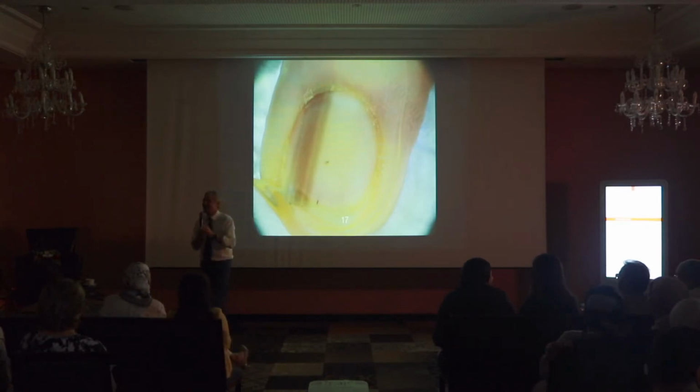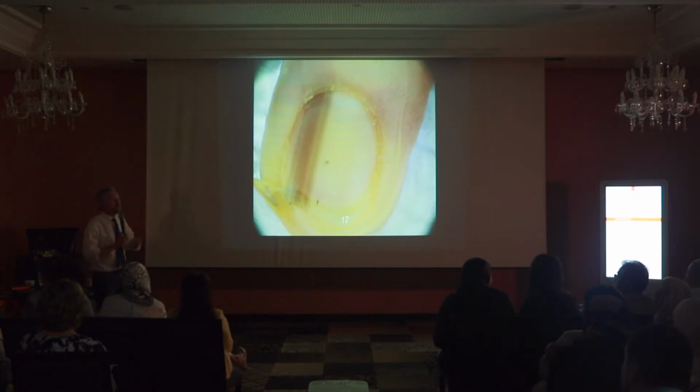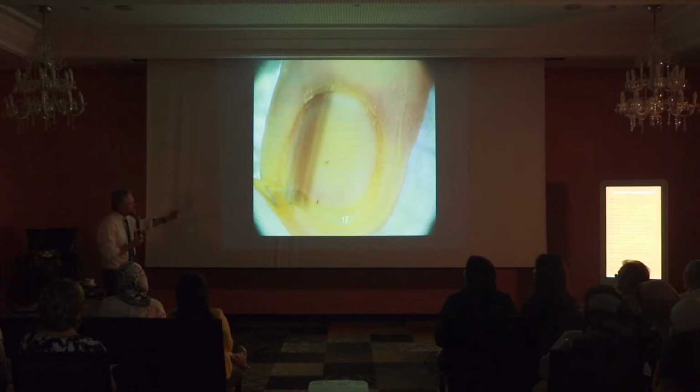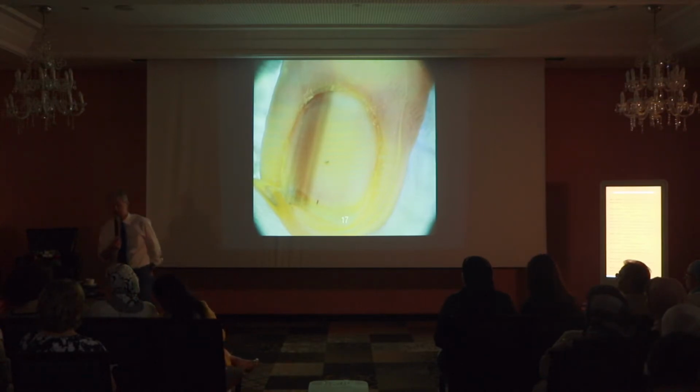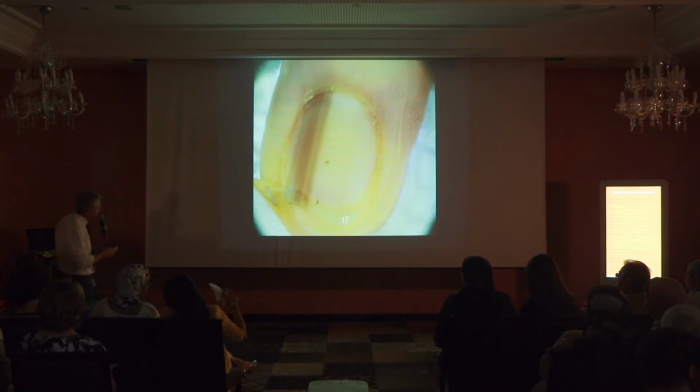So, it means that it's painful and so on. So it's better to make a follow-up here, right? It's 25 and the band is quite small. So let's make a follow-up, and the lesion was quite stable.